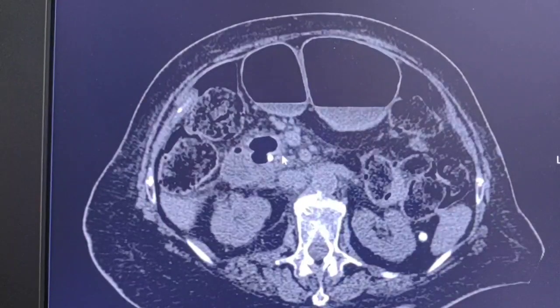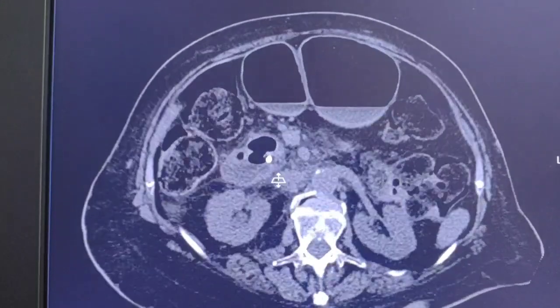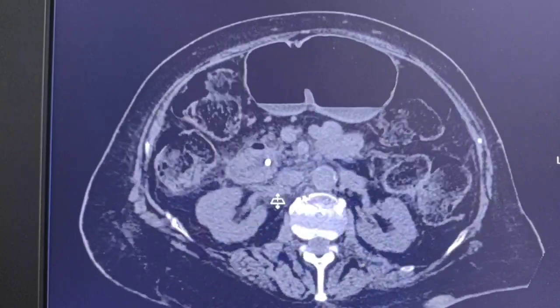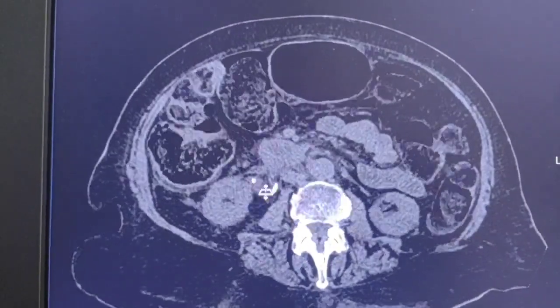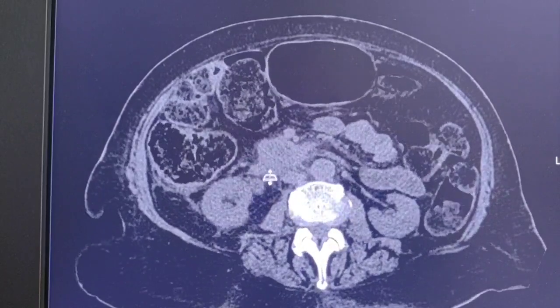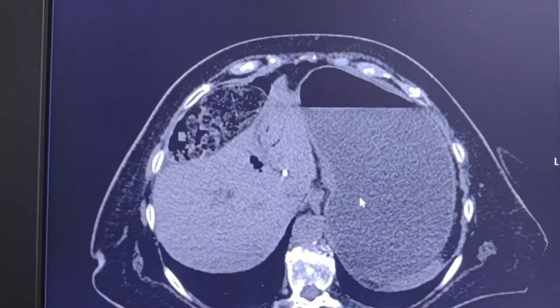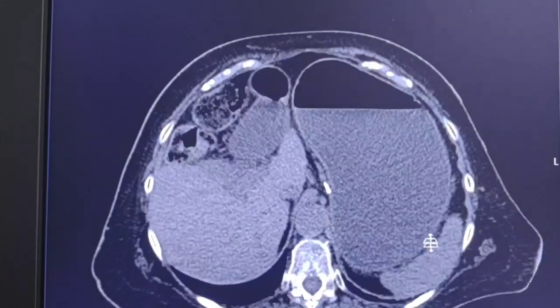The underlying cause of the reduced gastric output could be either a complication of the pre-existing diverticula of the duodenum, or secondary inflammatory changes to the duodenum from the malpositioned right ureteric catheter. But anyway, the gastric obstruction is a definite fact, as you can see.